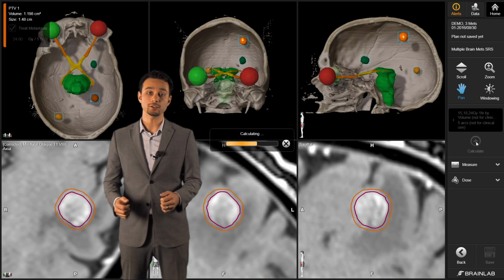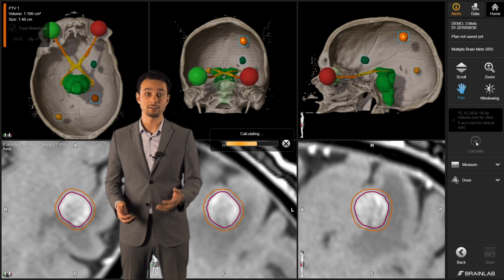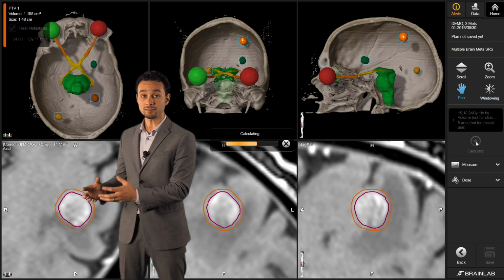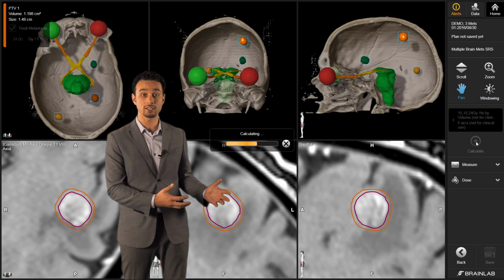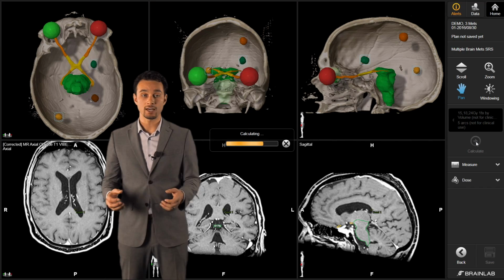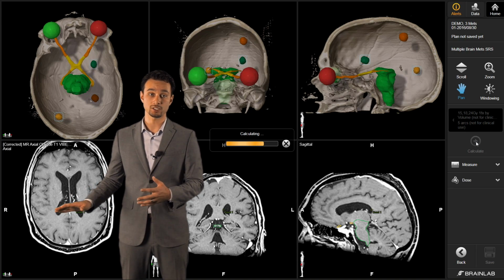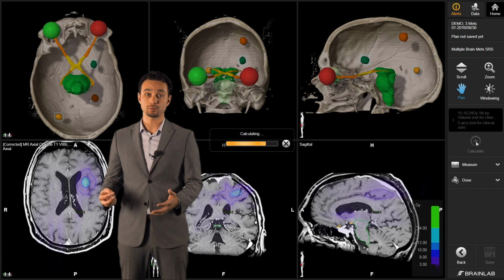If you look at what treatment modalities have been used for multiple brain mets in the past, a lot of it is conformal type treatments. And if we're using a margin, it's usually a 1 millimeter margin. We chose specifically to use dynamic conformal arcs rather than maybe volumetric modulated arc therapy because we wanted to give you something that's very MU efficient and something that can QA at the highest degree possible. So on purpose, we chose not to go with a VMAT type delivery. During the optimization, 2 main steps really happened.